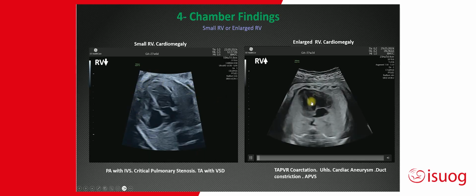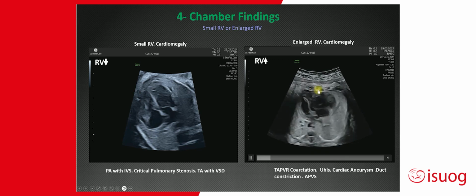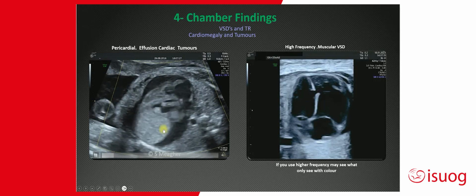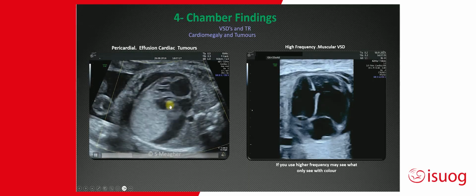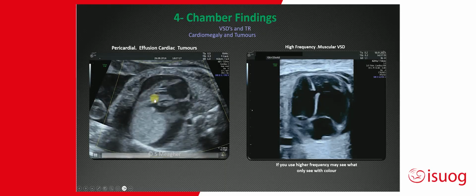Next, you see in this case, descending aorta, and therefore this is the right ventricle, which is grossly enlarged with pouching of the right cardiac ventricle in a fetus with a cardiac aneurysm. And then this case here, a very obvious abnormality with a large pericardial effusion, descending aorta, left atrium, left ventricle with a cardiac rhabdomyoma. Remember, once you see one, you then go looking for more.